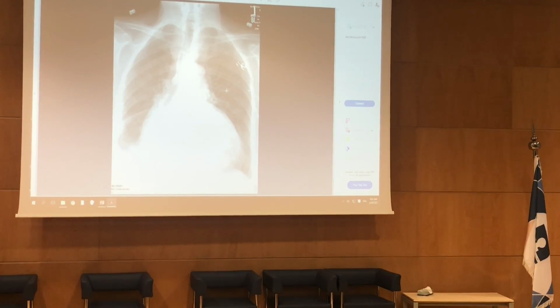Do we have an enlarged heart? Yeah, the heart seems enlarged, right? But the problem is that the patient might be sitting. I'm seeing here a bit of margin of the scapula, so there is a chance it's an AP. It's not marked here.